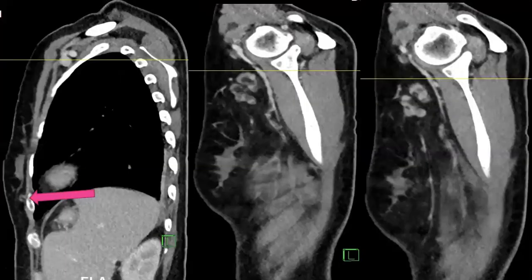And this is the lesion on the sagittal view. Look at the axillary lymph nodes, which are heterogeneously enhancing. There is also surrounding nodal edema and some enhancement, which is unusual with just reactive adenopathy. Okay?